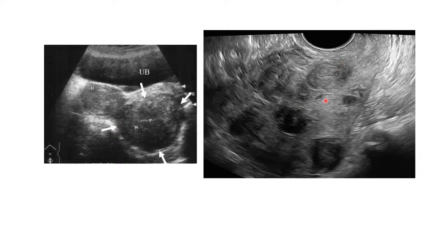So look closely here. You can see there are multiple lesions. So all of these ones, these are multiple uterine fibroids. So this is one of the problems in gynecology, because imagine if a gynecologist is going to do a myomectomy to remove all these fibroids, they have to cut all these pockets, all those pockets. So these ones are very complicated to manage. At times, the only remedy could be a total hysterectomy where they remove the whole uterus. Because you can see they are very diffuse, multiple uterine fibroids.